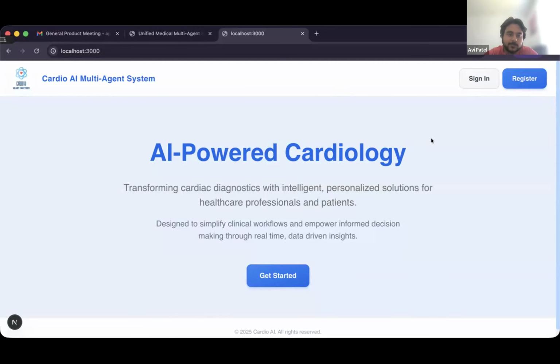And I'm going to be taking you through this clinician's dashboard demo. And I'll let Samson discuss a little bit more about this.